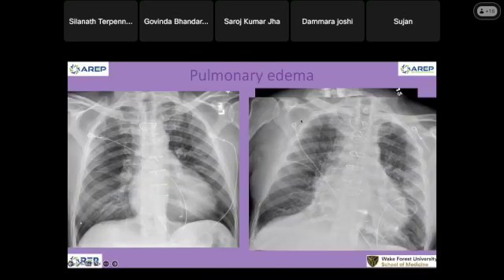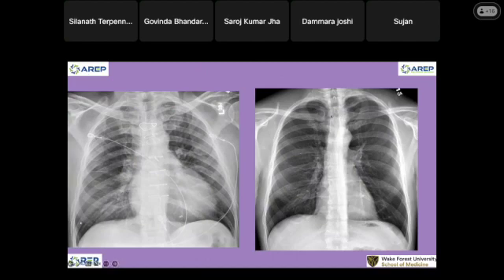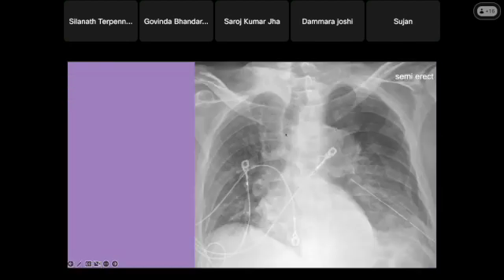So normally it should be straight down. If I go back to the normal case that we have, let me look. See that? It should be straight like that. Right? But this one is not. This one is curved a little bit. It's the deviation of the trachea to the right because there is a big aortic arch here. And when we get older, the vessel starts losing elasticity, so it's like something really hard pushing the trachea. So in a baby and in an elderly person, the trachea can shift toward the right. In a baby the trachea is so floppy, relatively compared to the aorta, which is harder.